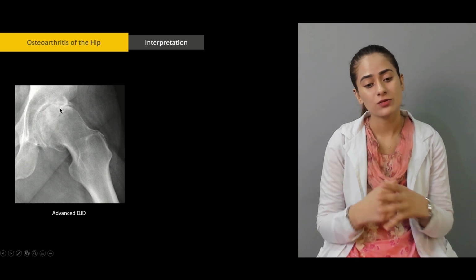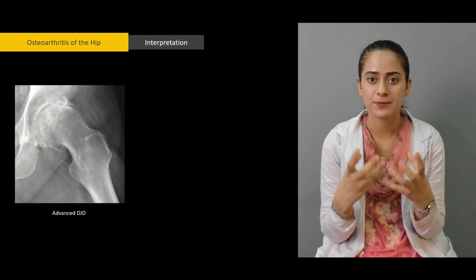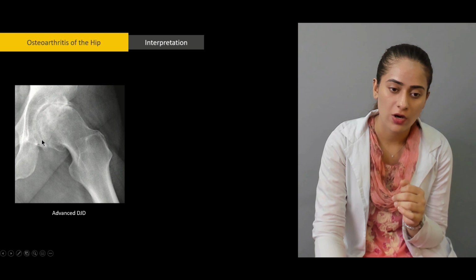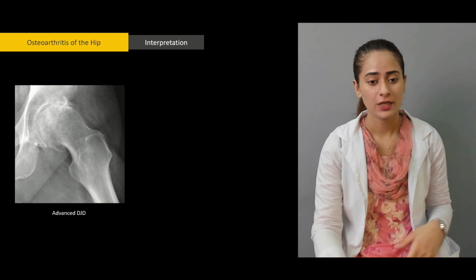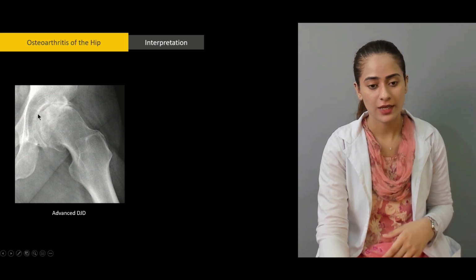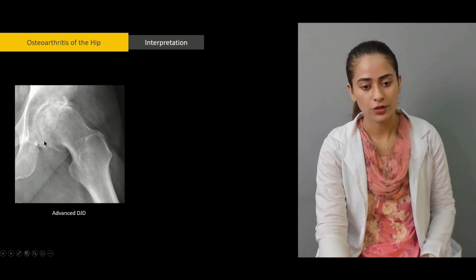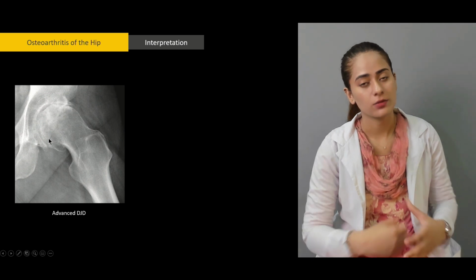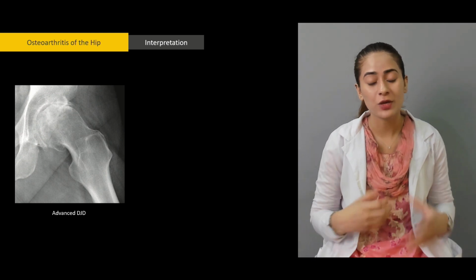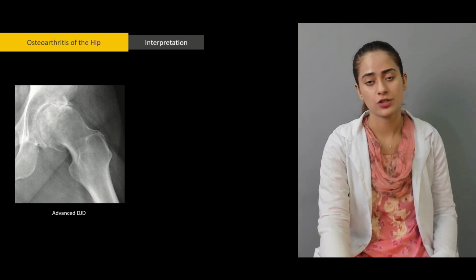What happens is there is almost no joint space, and the movement will actually create crepitus, and there are visible cartilage ridges here that will increase the friction in the movement. See here, this is not a smooth surface. It has these irregularities. So this here is very pointy. Focus on this area, and it's really pointy. So that'll create a lot of friction and problems and impingement, and then obviously inflammation. So this is advanced degenerative joint disease.